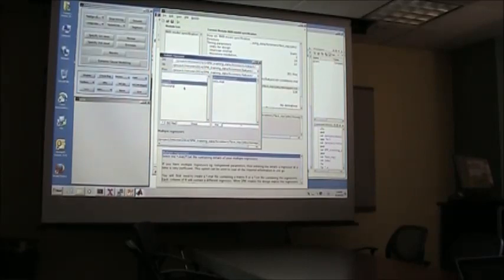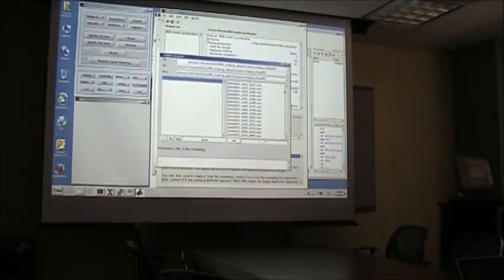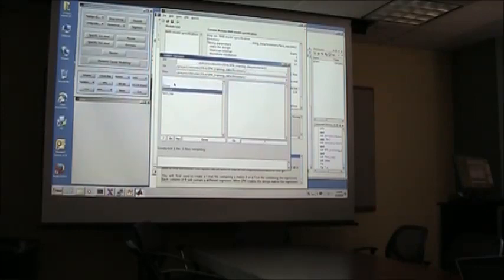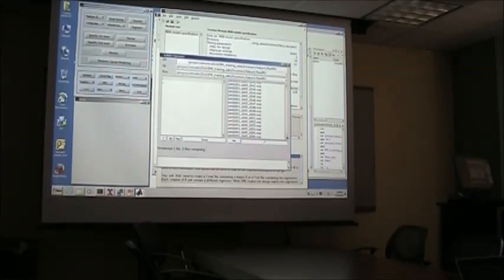Hold on. Another SPM mystery, but I'm not sure why only these files come up right now.